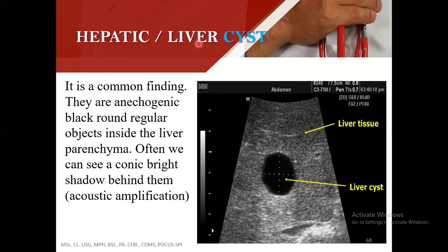Everyone's liver must not exceed 15.5, no matter your height or body habitus. So women mostly will have a liver of 14 cm or less. Men will have it up to 15.5 cm, but not above. Not to be confused, you can use 15.5 as your benchmark. Every liver must be 15.5 or below. It shouldn't go beyond 15.5.